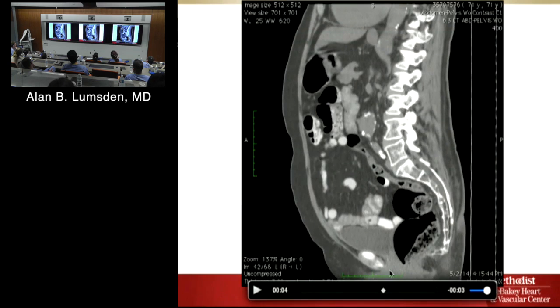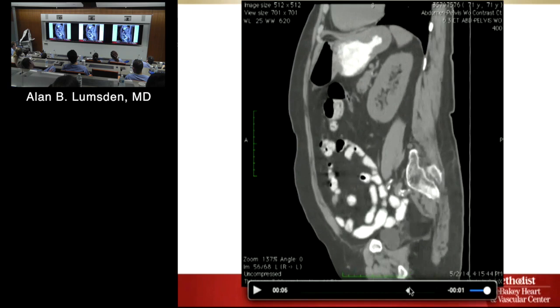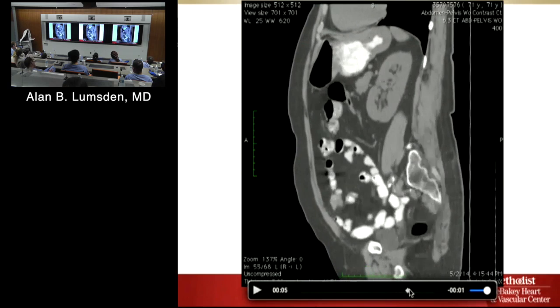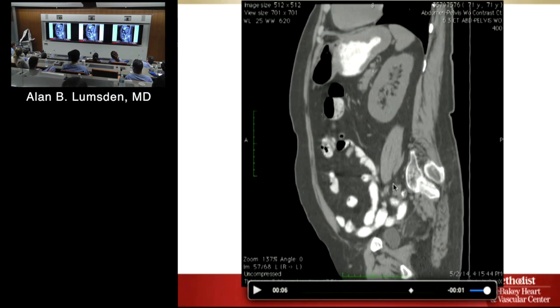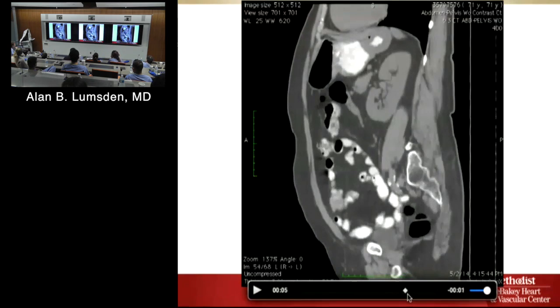Okay, what's that? I don't know which iliac it is. One of the iliacs. I don't know which direction I'm going in here. Okay, now watch what happens to the iliac. See how the iliacs swing way posterior. Look, it's coming down, swinging way back here. That's the iliac artery. So when you look at an AP aortogram, they look straight. They're never straight. They kind of go like this. And if they're small and calcified and rigid, that's a real problem in putting devices up there.